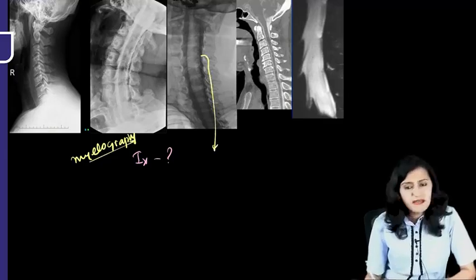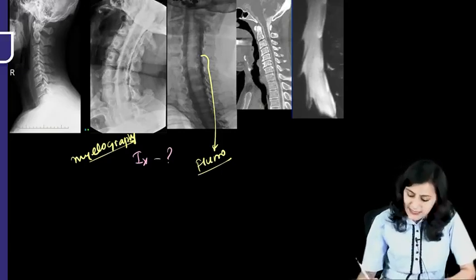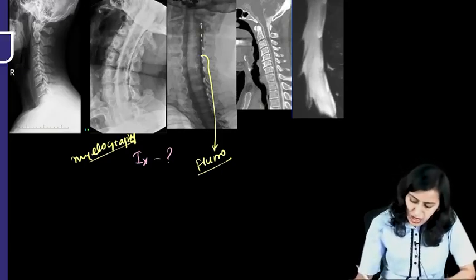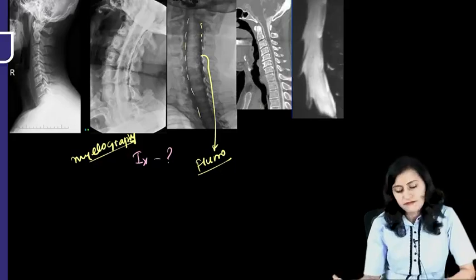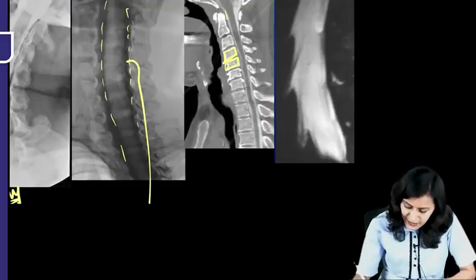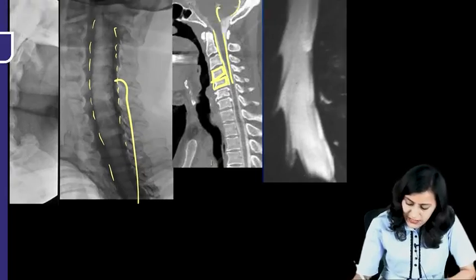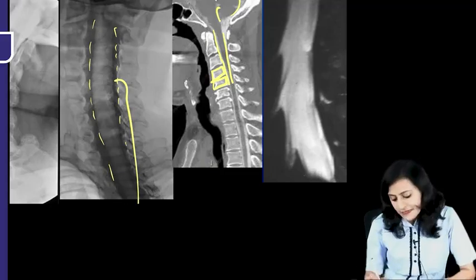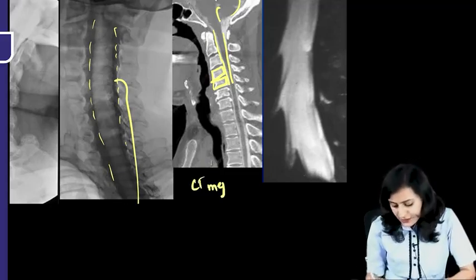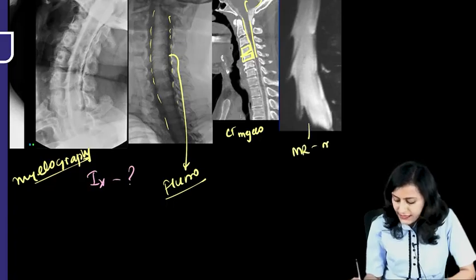This is the inverted image because any fluoroscopy image can appear black or can appear white. So the black here is actually the contrast. Again, this is a myelography. This is a CT scan with the white bone cortex, and again you can see this white contrast going into the subarachnoid spaces in the brain as well. So this is a CT myelogram. We can do it under CT as well. And this one is MR myelogram.